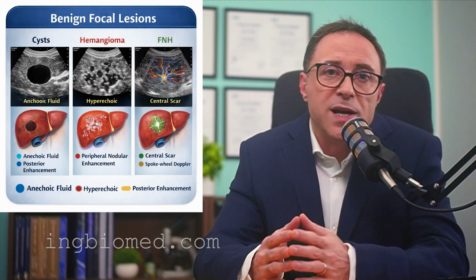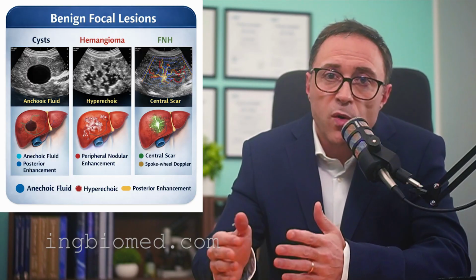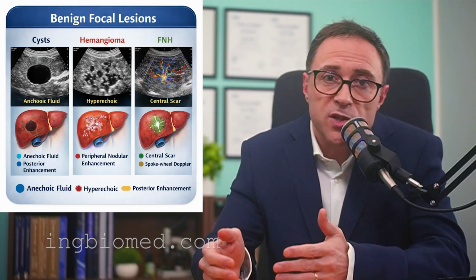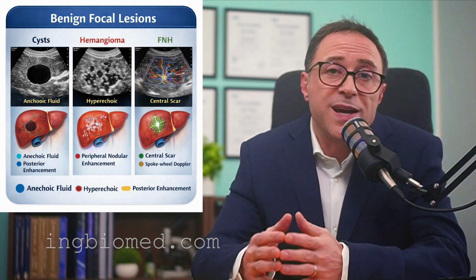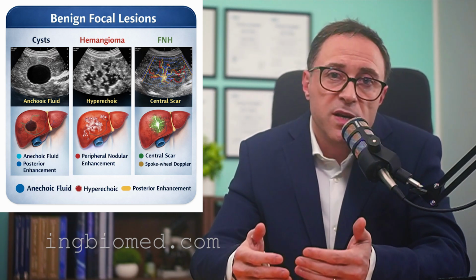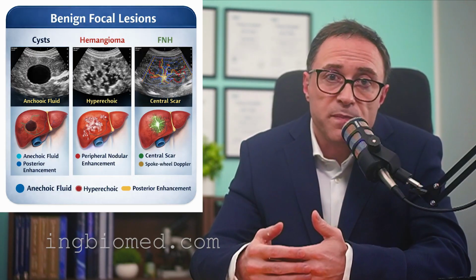Focal nodular hyperplasia may appear isoechoic or mildly heterogeneous and can displace adjacent vessels. In selected cases, contrast studies reveal a characteristic central scar with radiating vascular patterns supporting a benign diagnosis.